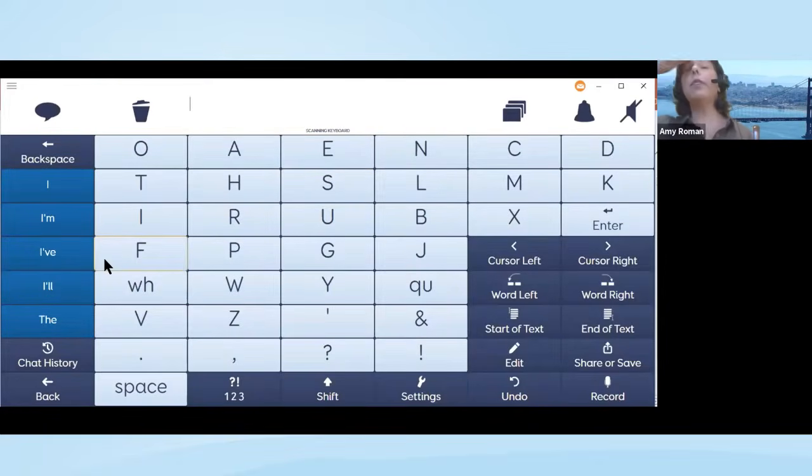And this is a frequency keyboard, but it's based on some research by a person named Peter Norvig, who determined that if you're using word prediction, the letters that you want to have in your frequency keyboard are really the letters that appear the most frequently in the first 3 positions of words.